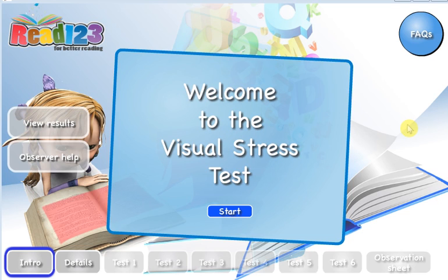We're going to show you how to use the software once you've installed and downloaded it. You should have a small icon on the desktop, and when you click that you will come to this screen. Okay, we're going to go into the basis of the test in a second. I just want to show you a couple of buttons on the home screen.